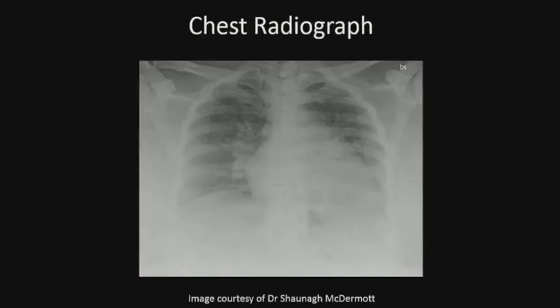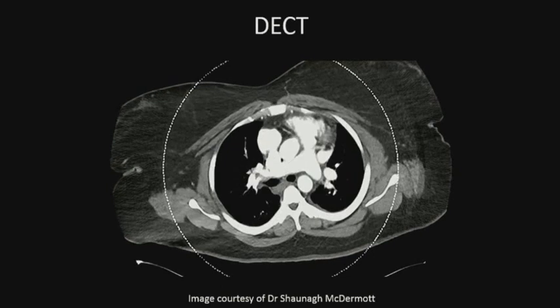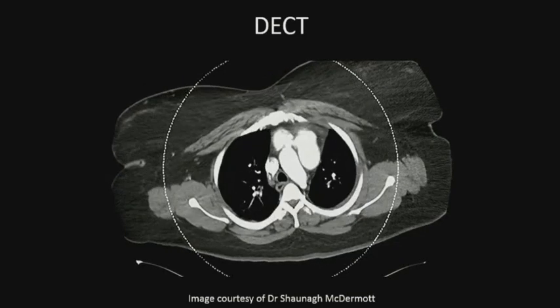This patient is a 36-year-old female who had shortness of breath over an 18-month period. She had a prior history of pulmonary embolism for which she was still being treated, and the diagnosis was made 18 months prior. The chest X-ray shows increased body mass index and cardiomegaly, and her CT shows bilateral occlusive pulmonary emboli in both lower lobes.